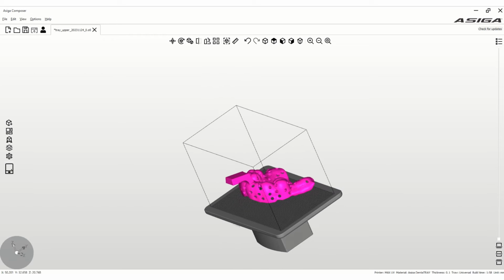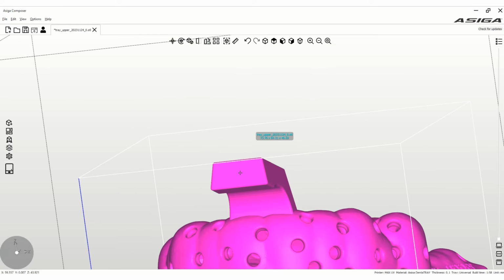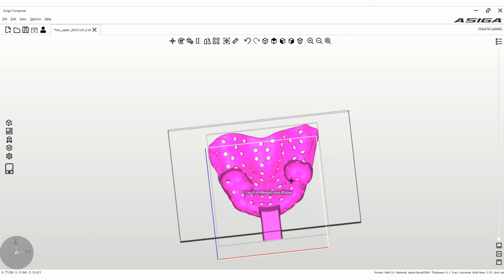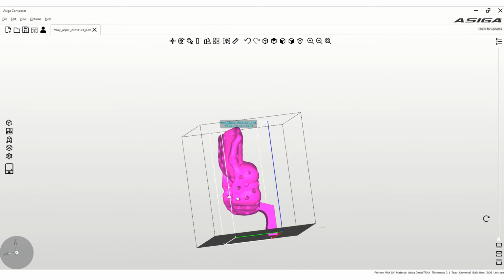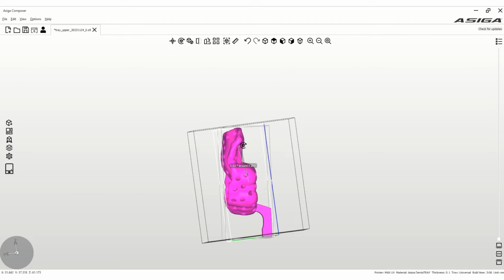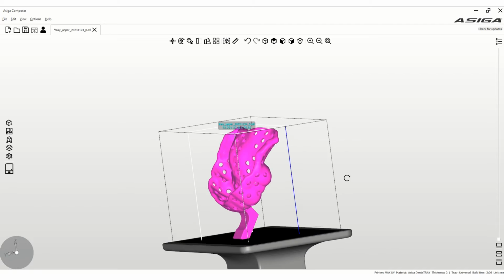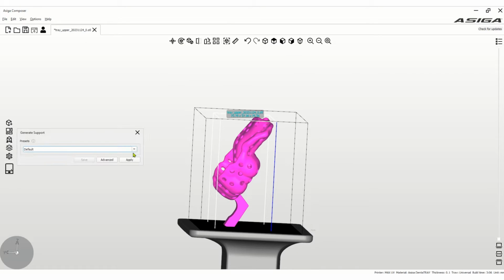So in general, how I'd print my trays, I'd highlight it, hit this rotate facet down button, click on the handle so you can see the tray in there, and now I drag that up to, say, the maximum height. The tray's obviously touching, so the handle is pink. I'm not going to lose sleep over that. Once I get it roughly on an angle like that, you can fit a couple in there. Add supports.